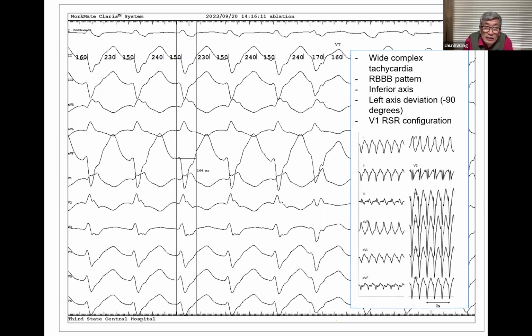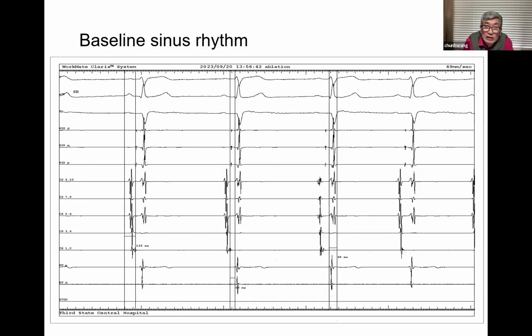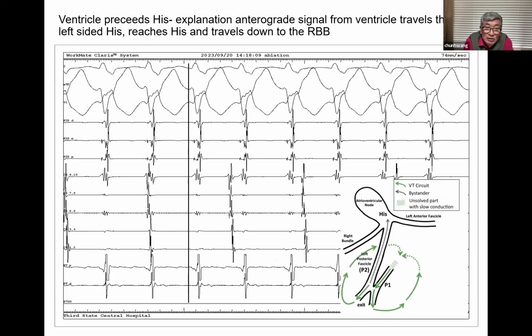And also, if you look at your intracardiac signal, go to the intracardiac signal. So you induced a tachycardia, right? Yes. Can you look carefully? What do you see in the right ventricle proximal signal? Yes, that's a small spike. Is that the right bundle? Yeah, I think it's the right bundle signal. Look at the timing with the His bundle. They're about the same. No, it's a little earlier, I believe. Or maybe it is all the same.